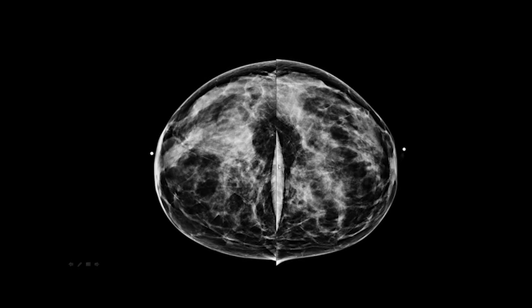So let's go over each of the 8 categories that the accreditation body scores. Now on this image, you can see here's where the nipple attaches to the breast. They're going to draw an imaginary horizontal line all the way across, and the nipples have to perfectly meet on those lines.